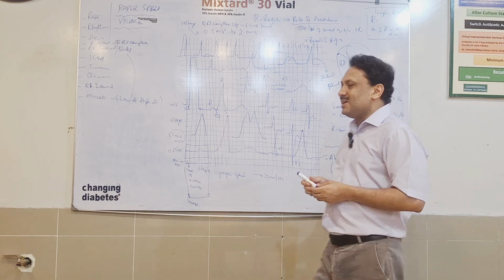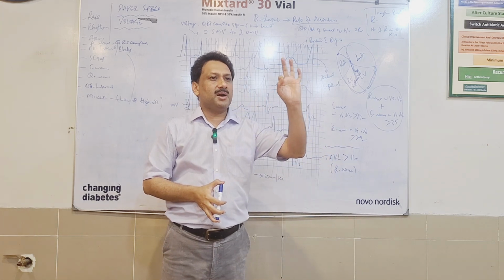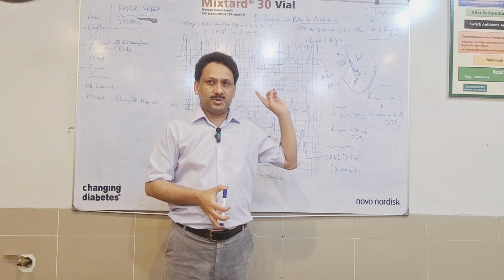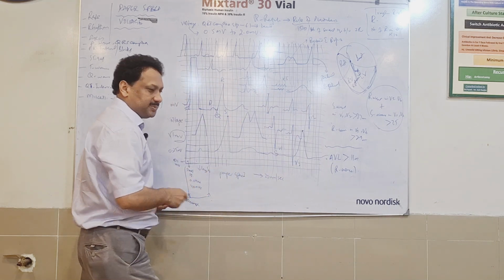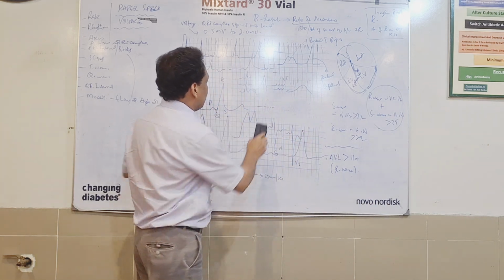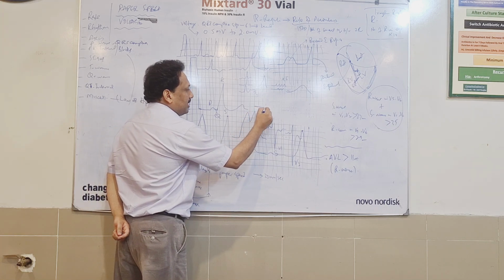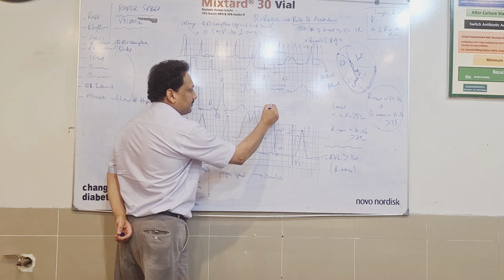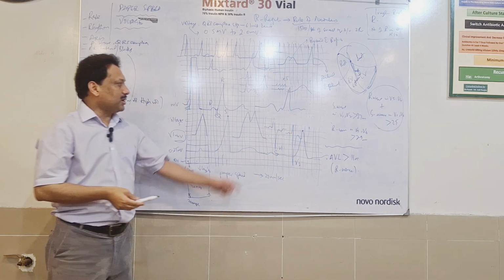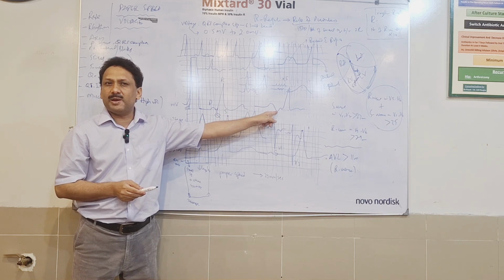Now we want to see the same two things in lead number V1. So either these P waves are seen in lead number 2 or V1. In V1, the situation is a bit different. In V1, we would be focusing on leads that way. In lead V1, the P wave is having two components. This is QRS complex. Just focus on P wave. This is above the baseline. That one is below the baseline.